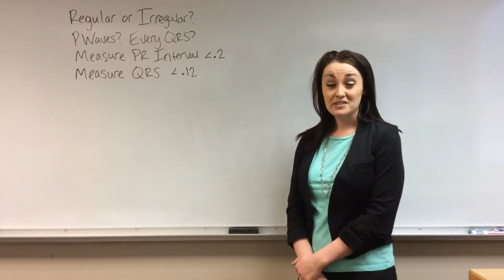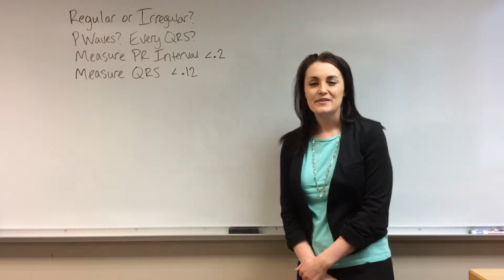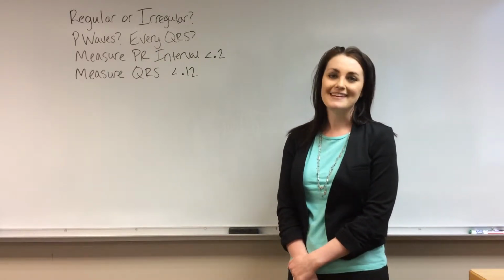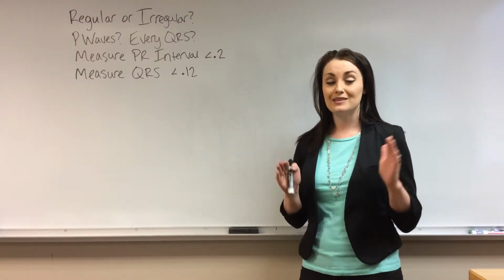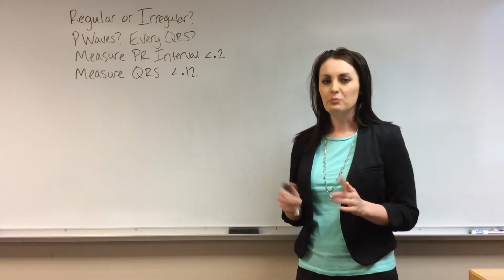So this is part 2 of the videos for rhythm analysis. And in the first video I talked about the different sinus rhythms: normal sinus, sinus bradycardia, sinus tachycardia. And then we talked about the different AV blocks, which remember are the issues with the PR interval. Issues with your PR, you think AV block.